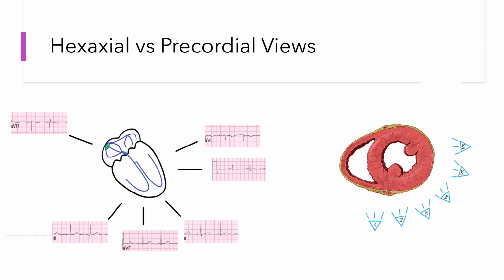While this is on your screen, just to give you a good example, if you're seeing some changes in lead 3 that are concerning to you, the lead you want to look at for reciprocation is lead AVL, because it has the highest angle of reciprocal view compared to lead 3, and vice versa. If you saw changes in AVL, you'd be looking at 3. We'll revisit this as we go, but it's important to commit to memory and master where all these leads look.